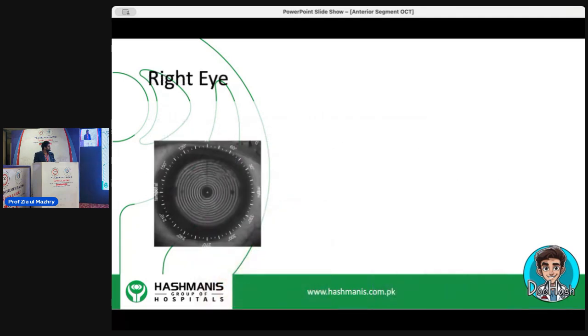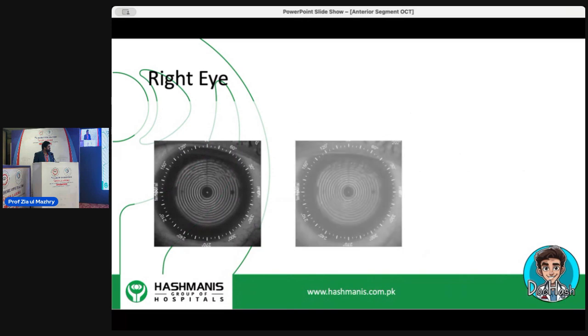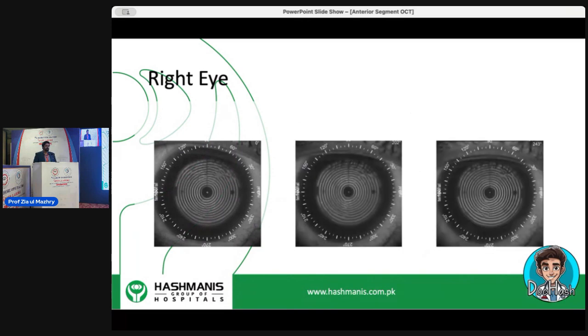तो अगर हम, so this is beyond OCT. So this is a placido disc image जिसमें हम breakup times देख रहे हैं basically. तो अगर आप देखें, there is points where the placido mires are not meeting, and this is basically known as breakup of the tear film. तो ये एक ही जगह पे हो रही है अगर आप देखें.